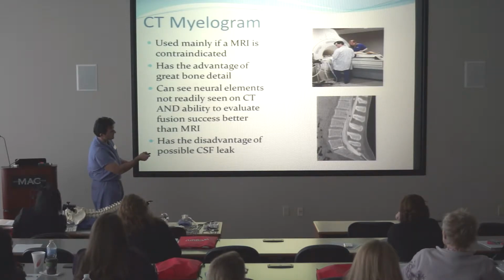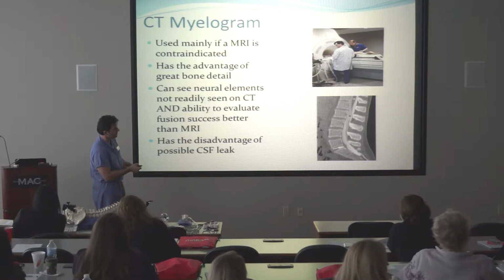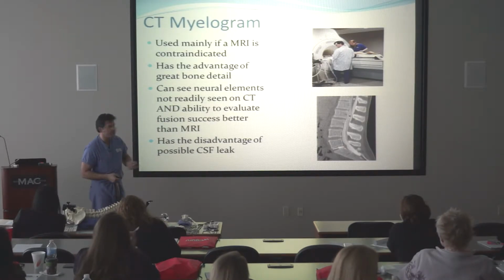So there's your bottom, your spinal cord comes to a point right there, and then down here are the strings of spaghetti that hang off of it that make up the spinal canal of the lumbar spine. All right. See the disc? So that's what you're kind of looking for there, something indenting the canal there. This is not the same CT scan, obviously, as the fracture.